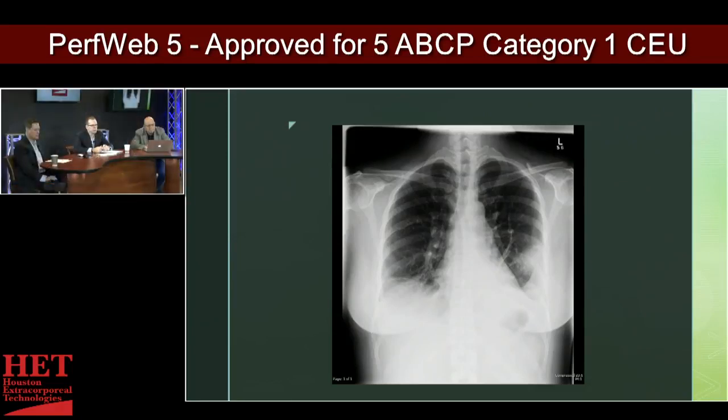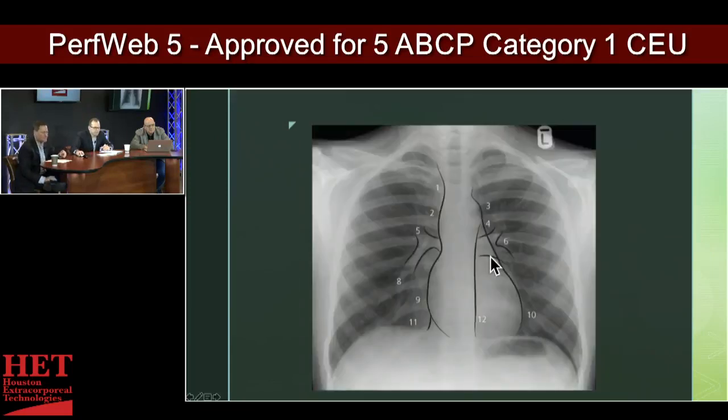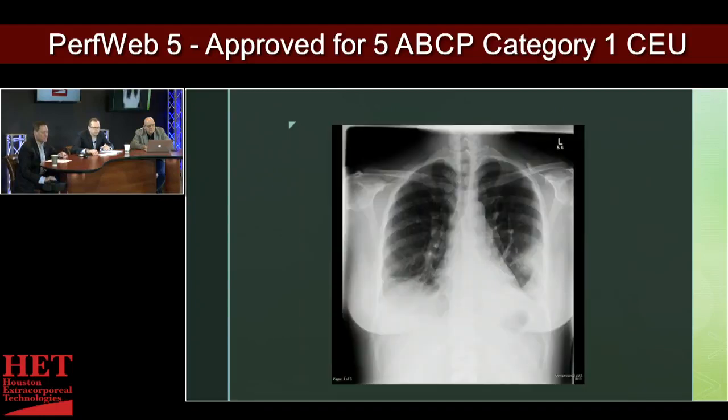So this would be a classic example of a patient that presents to the emergency room, a couple of days of shortness of breath, maybe a little bit of pain when she takes a deep breath. What is that black line right there? You see that? Is that nothing, or is that just? Yes. I see a pretty distinct line along the lateral border, the left lung lateral border.